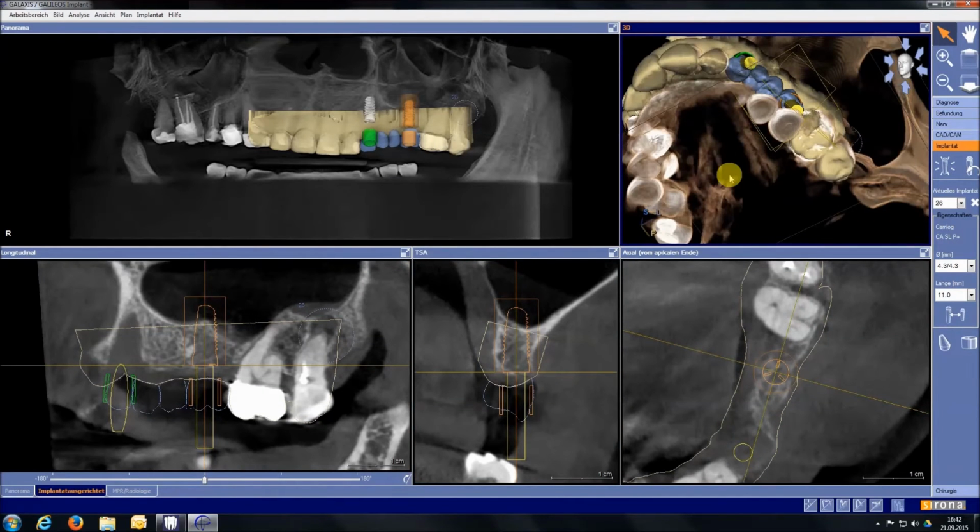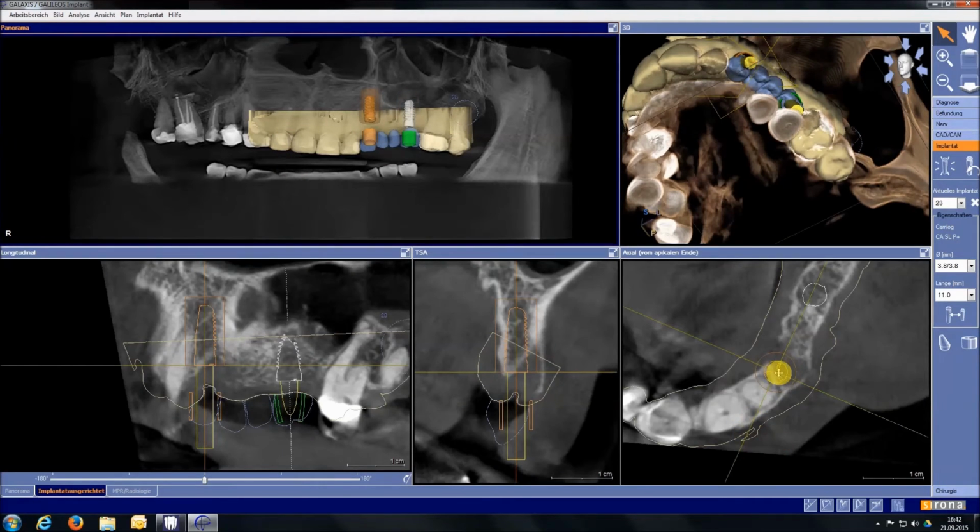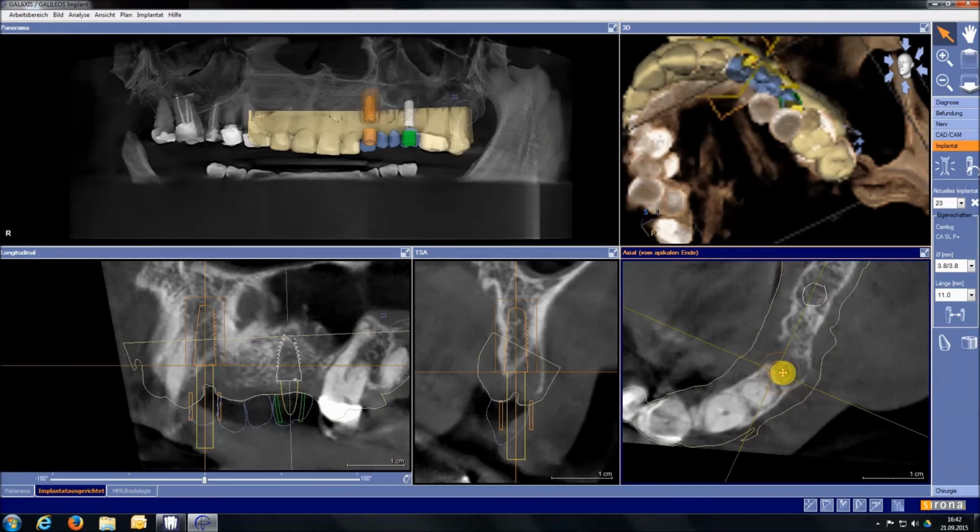The 3D view allows you to check parallelism to a certain degree. In this case, parallelism exists. You can also see that the implant at 2-3 is outside the planning. You should try here to push the relevant implant further inwards. In cases which are as difficult as this, it can be achieved by inclining to enable the subsequently desired construction.